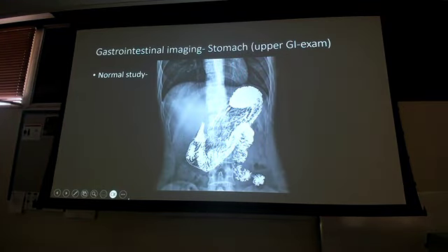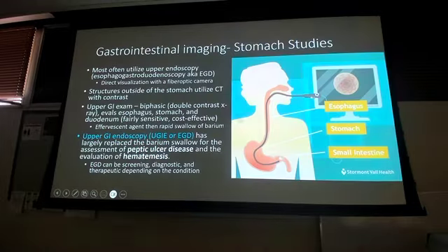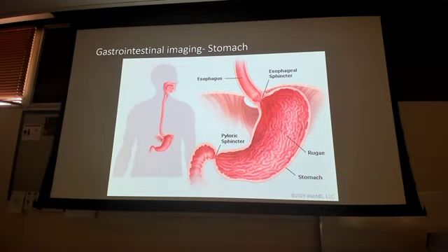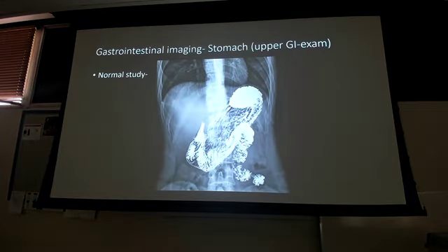Here's what a normal study looks like. Why do I have pooling here? What area of the stomach is that? Go back to anatomy. What's that area of the stomach called? Fundus. Ring a bell? Phase one, freshman semester, A and P, right?